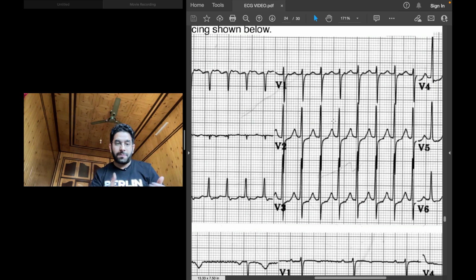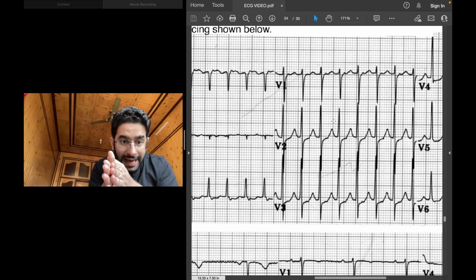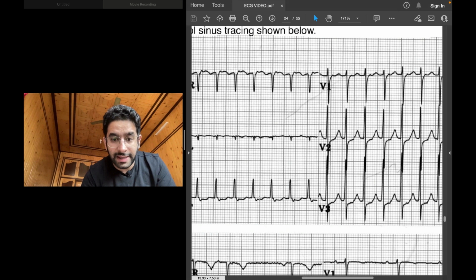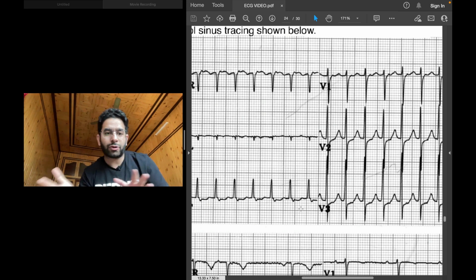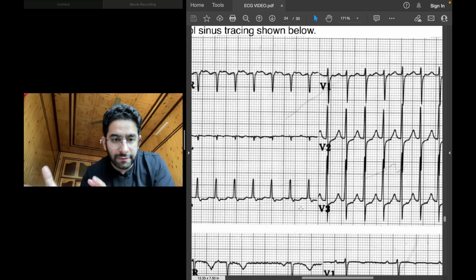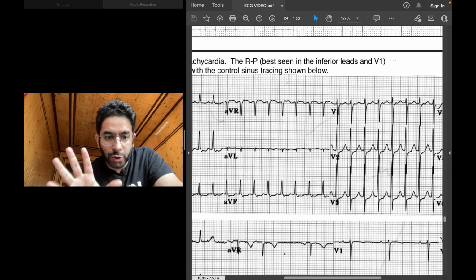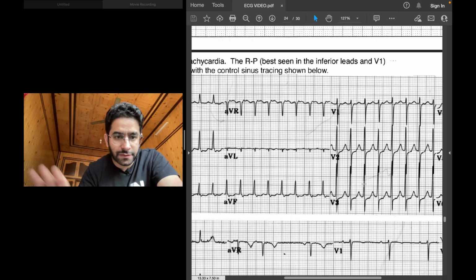When you see such an ECG, fast heart rate, tachycardia, and narrow complex. The QRS is quite narrow, it's less than 120 milliseconds. It is regular. You're not able to clearly discern the P waves. You may find P waves if you look very carefully, for example, out there, but they're not very clear. So that's an ECG of a supraventricular tachycardia. That could be an AVNRT, or that could be AVRT, or that could be another form of supraventricular tachycardia. But this is what you know. Fast, narrow QRS, regular, think of SVT. Okay.